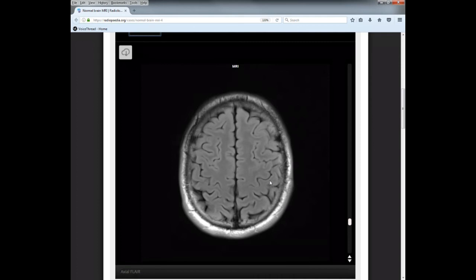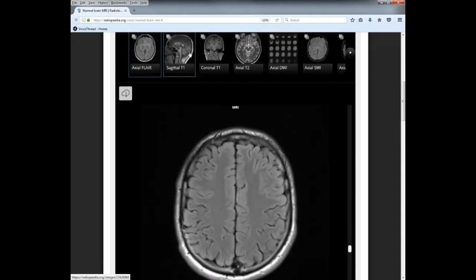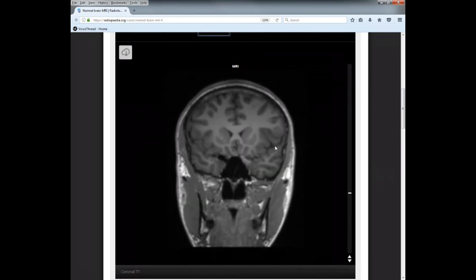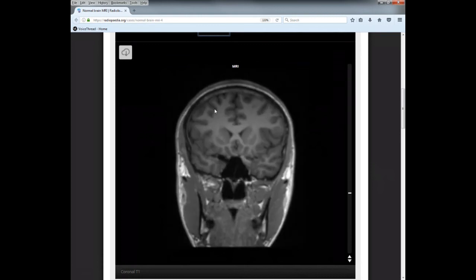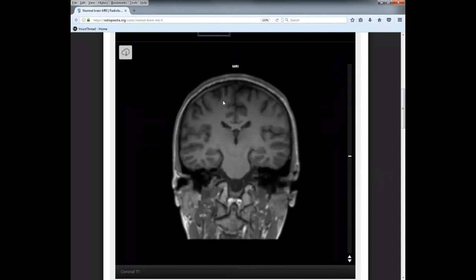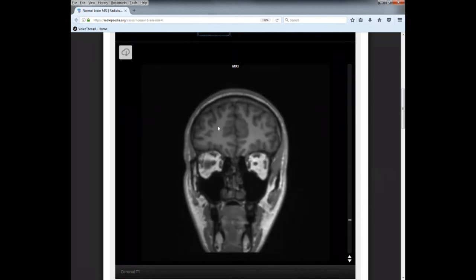The only other thing that I wanted to show you was the lateral fissure, which you can see in a coronal, and it's right here actually. It's a good slice. Okay, looking at the lobes in the different view. Here's your lateral fissure. So this is temporal lobe, okay. And then up here, if you're super anterior, then you can say without a shadow of a doubt that this is frontal lobes, okay?